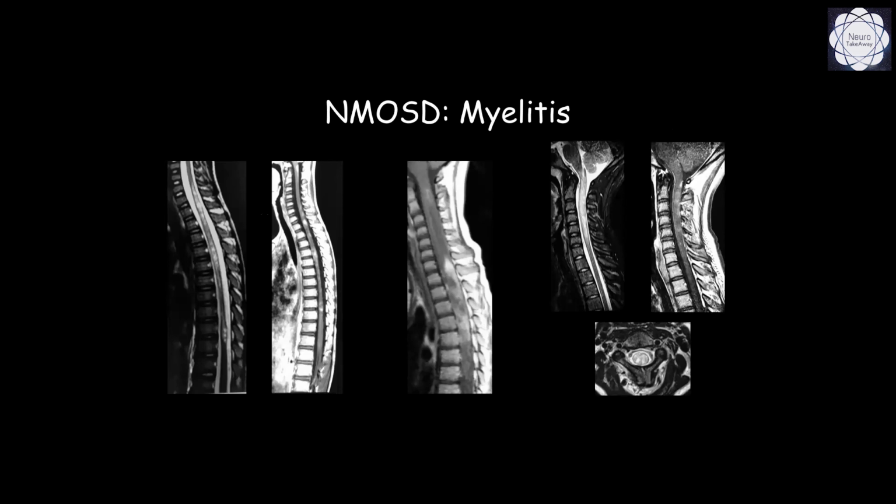The lesions look ugly. You can see here the expansion of the cord with a heterogeneous pattern of enhancement. Sometimes we have another type of enhancement that is very specific, as is the lens enhancement. Here we have the hyperintensity, which is associated with bright spots, typical of this process. And it usually compromises the cervical cord, going up to the cervicomedullary junction.